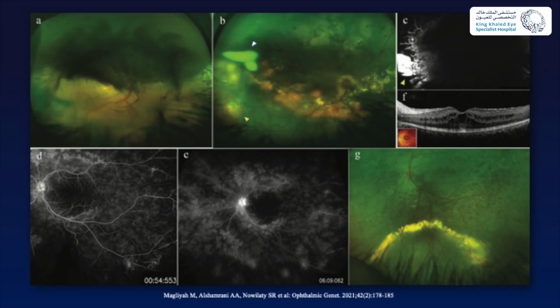The upper 3 photos are for another patient with extensive lipid deposition, exudative retinal detachment, and a vasoproliferative tumor infratemporally. This patient received multiple sessions of ablative therapy in terms of laser photocoagulation.